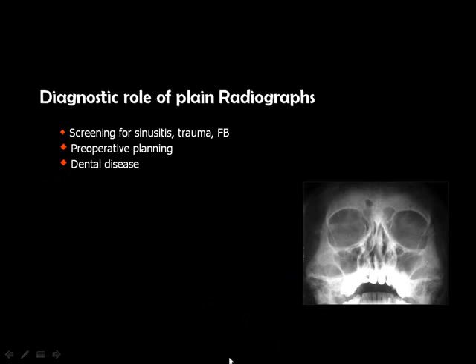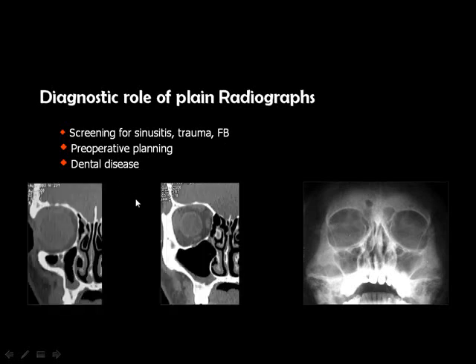Then in the days before the era of CT scan and the advancement in the newer generations of the scan, we used to assess the paranasal sinuses by the plain films. But the role of the plain films has now relatively regressed in comparison to the advancement in the use of the CT scans, either the routine study or the full study. The role of the sinus view is limited to screening of cases of sinusitis and in some cases of trauma and possibly in suspected foreign bodies. It may be used also for pre-operative planning or assessment of dental disease.